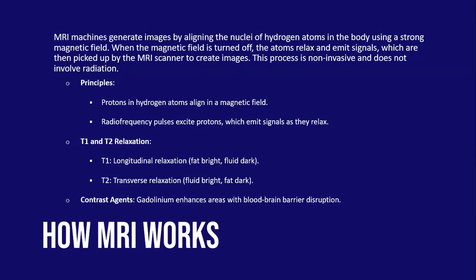And the right word to use there is that it's going to be hypo intense. Then in T2, when there's that transverse relaxation, you would have fluid appearing bright, whereas fat that has less fluid content appearing dark. So the differences would come in with regards to like brain matter, white matter versus gray matter, with regard to the fat content that they would have.